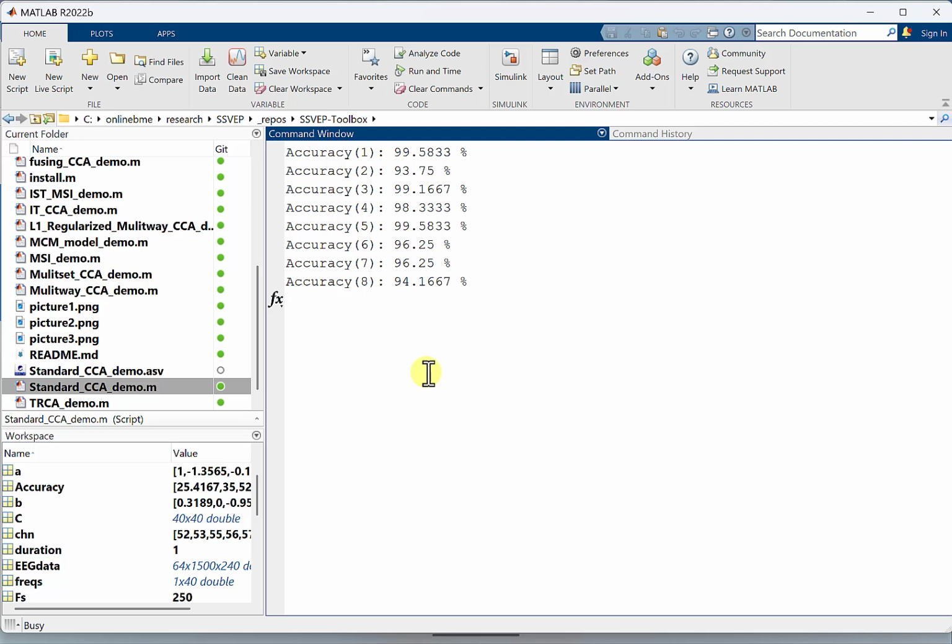If you want to customize the code for your own dataset, first understand the benchmark dataset and see how these codes are written based on that dataset to process its information. After that, when you get familiar with the dataset and the demo codes, you can easily customize the codes for your own projects. I think I explained everything that was needed.